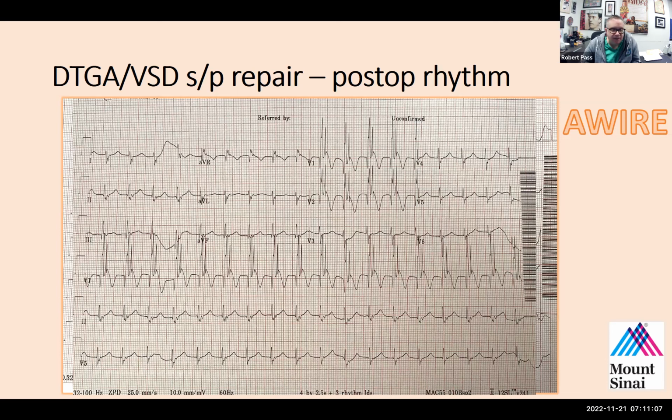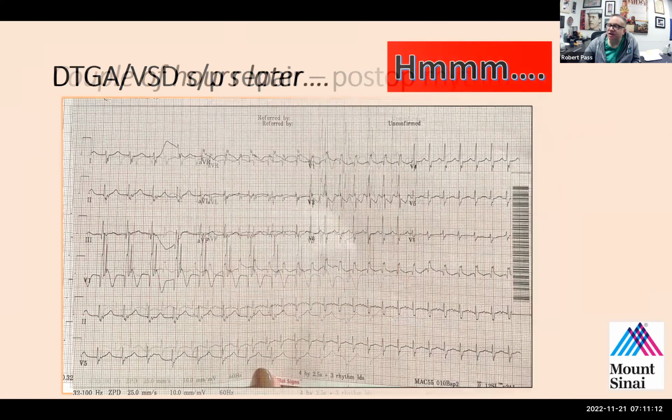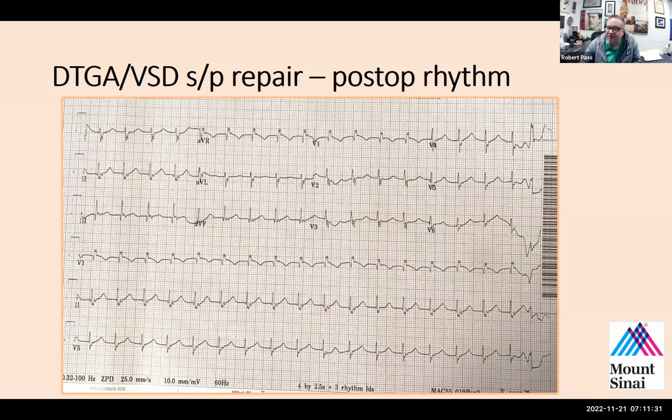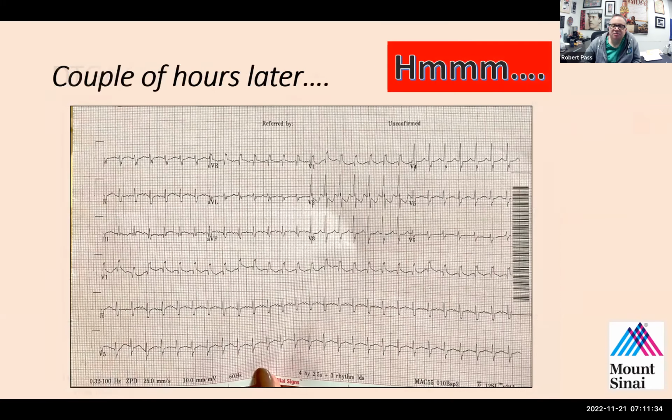And then at about 2 or 3 in the morning, I was asked to assess this electrocardiogram on the same patient. So let me go back to Dr. Bebia. Sergey, this was the very calm tracing a couple of hours earlier. And we've been A-pacing at 145, and I was told that all of a sudden the heart rate got faster. So this is a 12 lead of that patient. What do you think is potentially going on here?